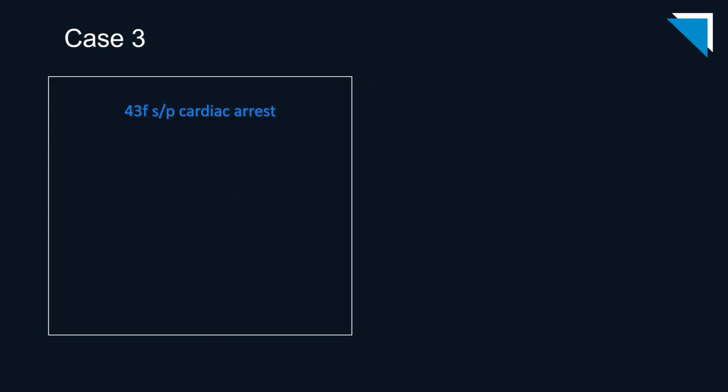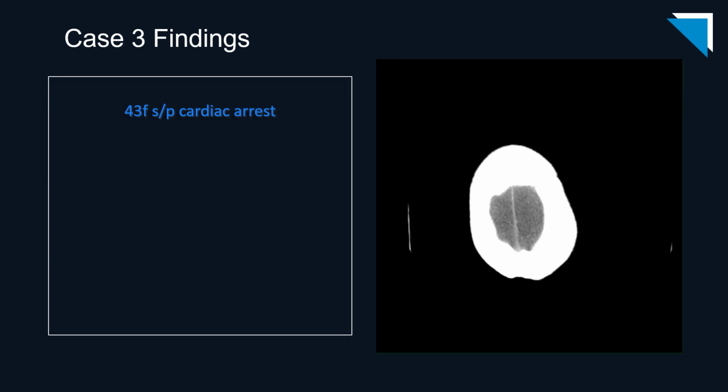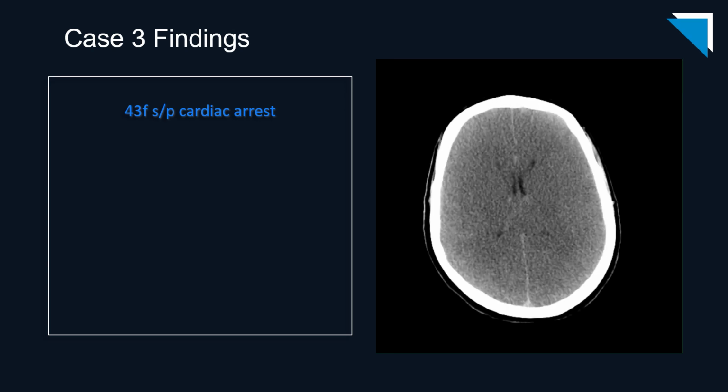I'm certain if you'd called the referring clinician for the last patient, they would have given you appropriate clinical history. In this case, we were fortunate enough to have it. This is a 43-year-old woman, status post-cardiac arrest. The axial images from a non-contrast CT scan of the brain.